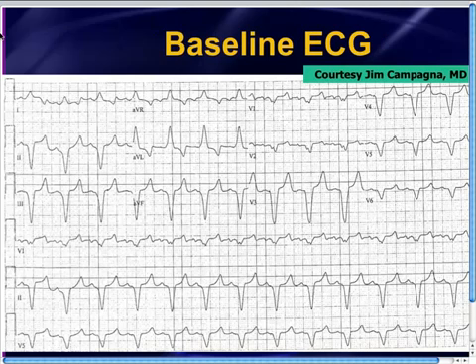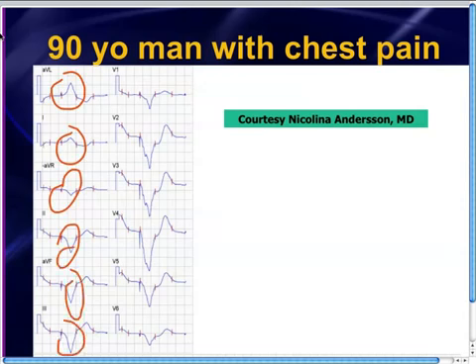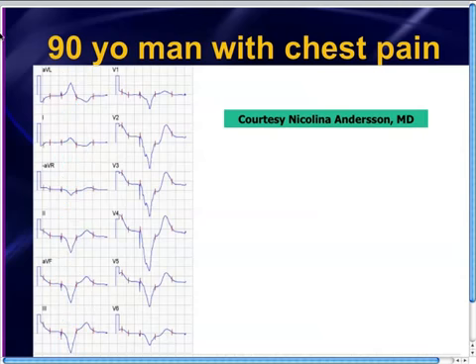All right, so going back to this baseline, actually let's skip over this and let's go back to Dr. Anderson's EKG. The EKG gives us nice little hash marks to point out the J points. And this lead, this lead, this lead, and so on. These are all okay because you've got normal expected discordance of the ST segments, but where is it abnormal? Let's take a look at V1. QRS mainly points downwards, so we expect to see isoelectric or maybe a little bit of elevation of the J point, and that is present, so lead V1 we're happy with.